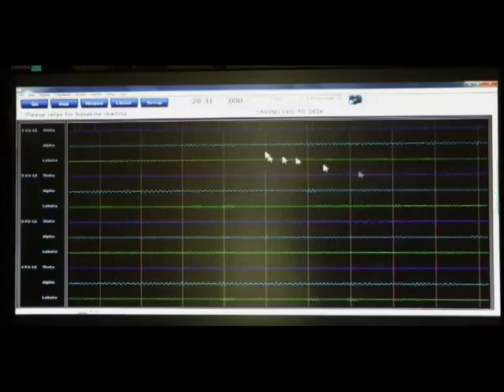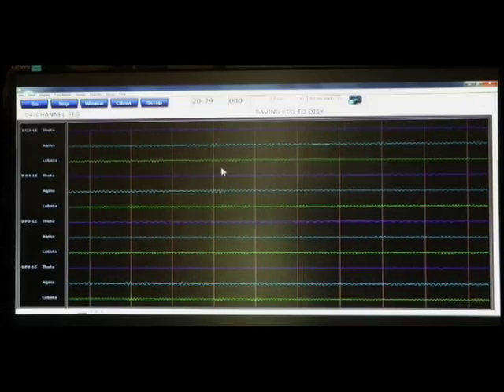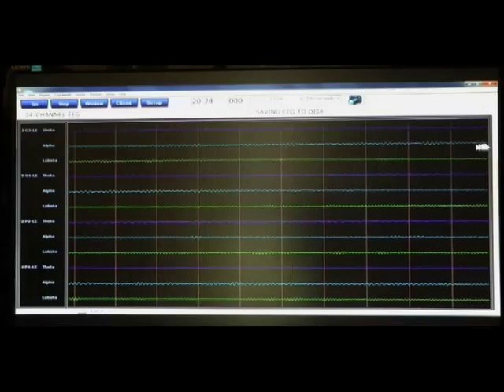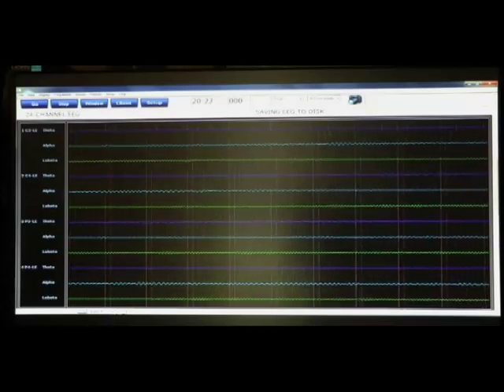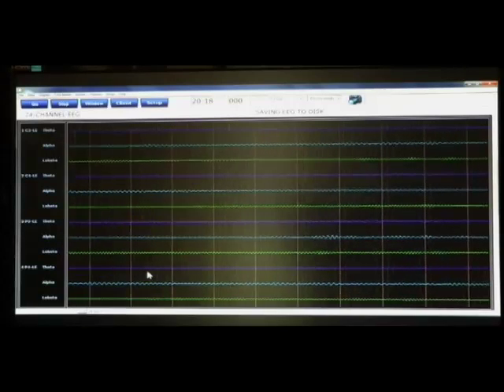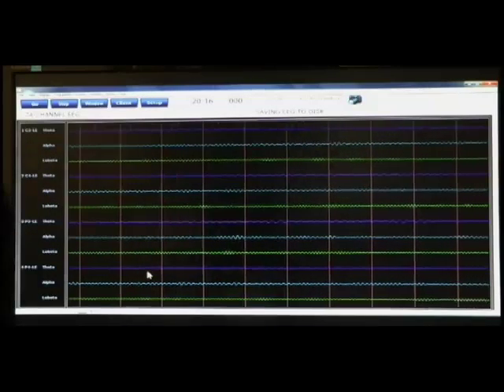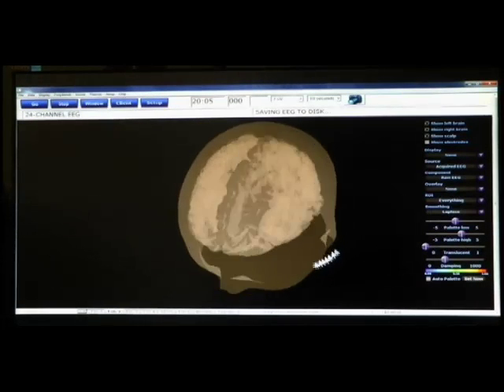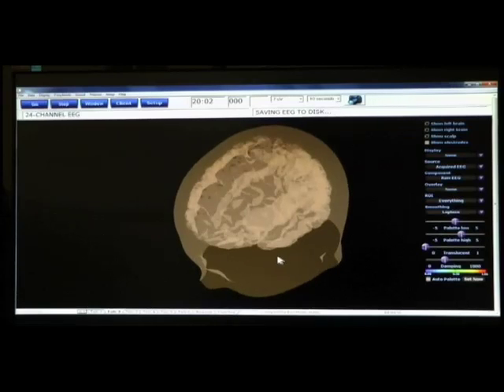Okay. Now let's talk a little bit about the training screen for the new Brain Avatar software. Some really cool advantages. You have some tabs along the bottom, and we see tab 1, tab 2, tab 3, and you can actually modify and name the tab, put your terms on the tab, and that's shown in a different video segment for the screen editing. But if I click on tab 2, I get to see the example of our head display again. Okay, just showing you the example of the display.